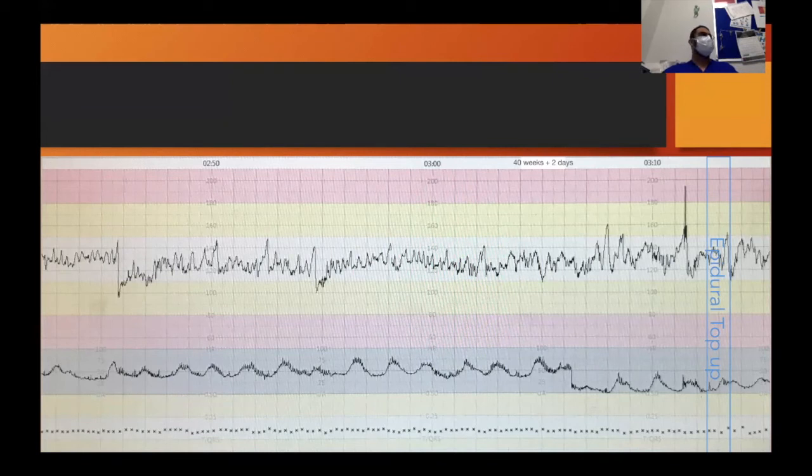Which takes out the element of, yes, obviously we're in a CTG meeting, hence this has to be a horrible outcome. Every single blip on the trace has to be now a late deceleration or a problem. Does that make sense? Just for the future, for when you're making assessments. Okay. Would anyone like to assess this trace?